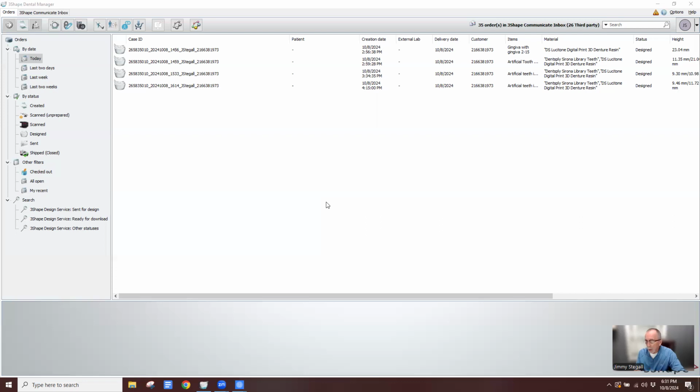So we're going to talk about copy dentures. We're going to talk about partials, and we're going to talk about locator or overdenture in general. I'm going to show you how I do those cases, and then I'll finish with three or four slides showing how I do a two-appointment conus, which could easily be a locator as well. So let's start with the copy denture workflow.